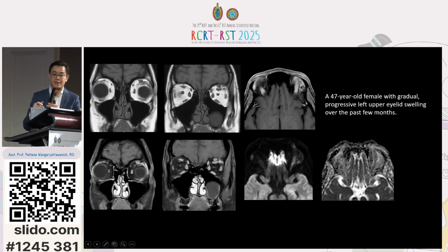So it could be a variety of tumors that start from the lacrimal gland. Initially, we thought it could be adenoid cystic carcinoma, a pretty malignant tumor that can occur in the lacrimal gland, and it has a very high incidence of perineural tumor spread. And this is the corresponding axial post-contrast image to show you that area of tumor and a little bit of restricted diffusion on DWI, confirmed on the ADC map.